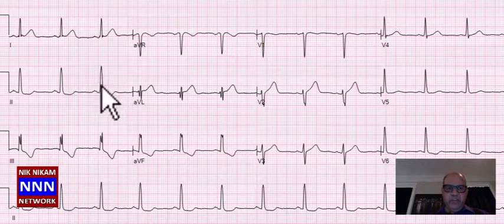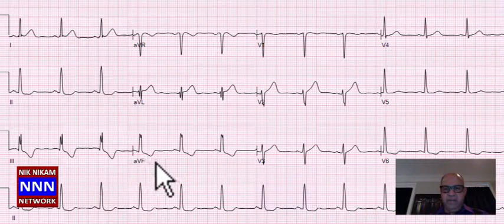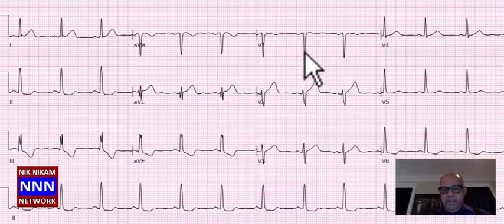You have a nice sinus rhythm. T waves are inverted in the inferior leads, at least in 3 and AVF, and anterior leads look all right. Lateral leads, we have some STT changes. So this is an abnormal electrocardiogram with a normal sinus rhythm with the infralateral STT changes. So you need to begin to wonder about the possibility of coronary artery disease, and that has to be substantiated with other tests like X-ray, echocardiogram, and perhaps a nuclear stress test.